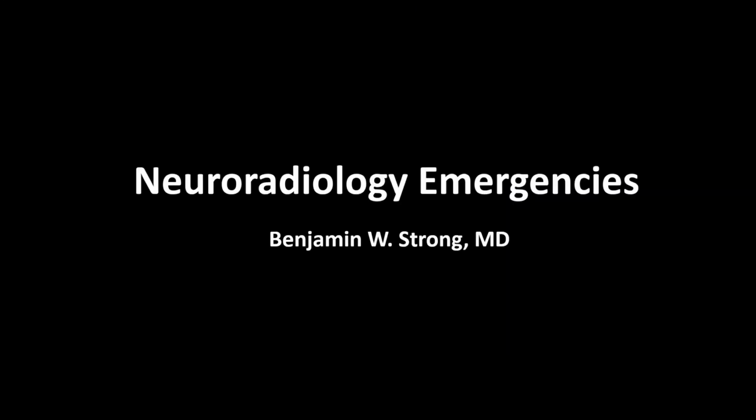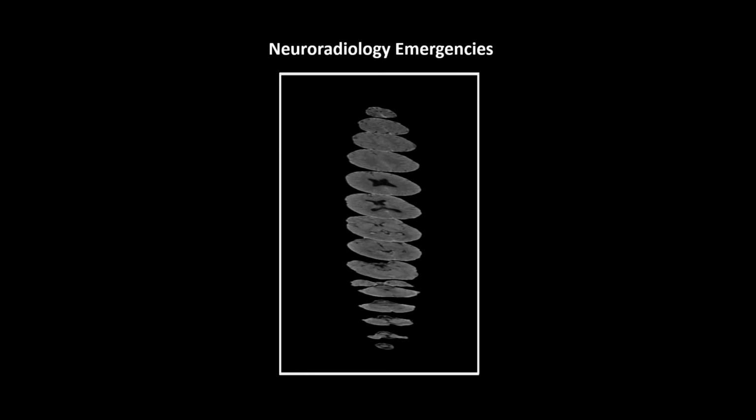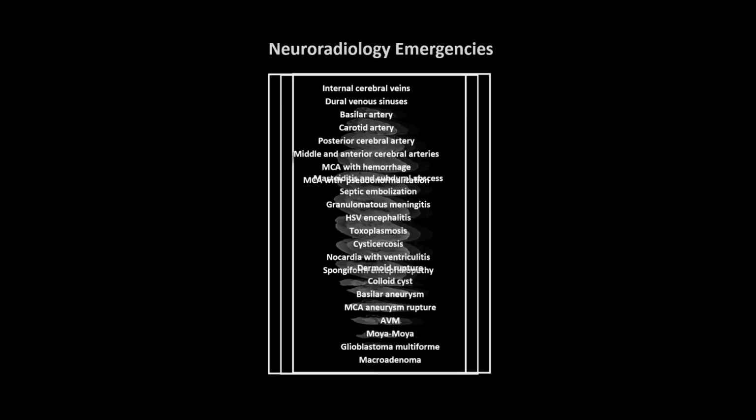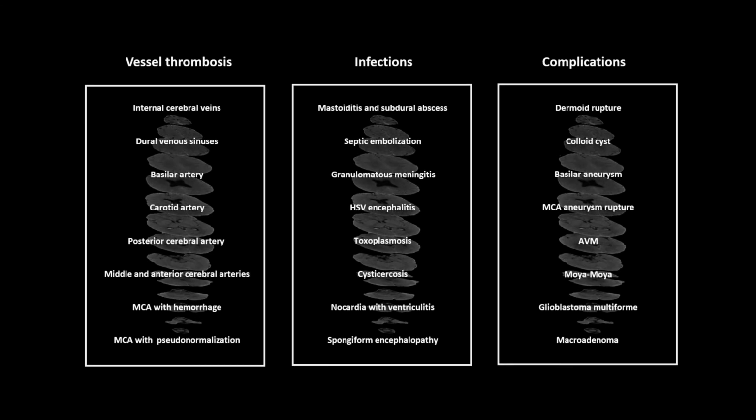Emergency neuroradiology, and I've broken these into a collection of emergency cases and a collection of trauma cases. So we'll be looking at 48 neuro cases. These are all non-contrast head CTs.